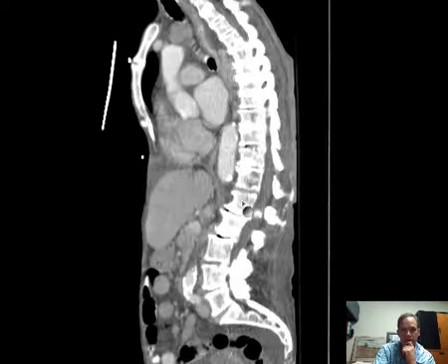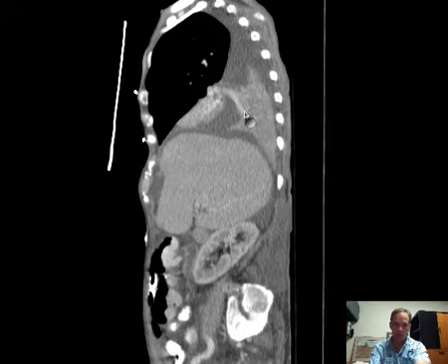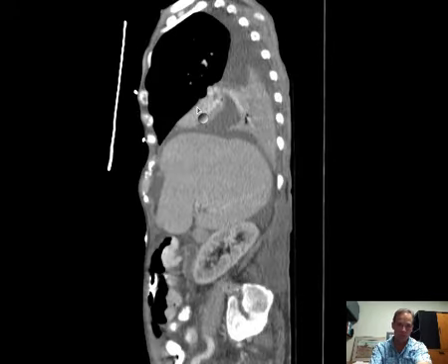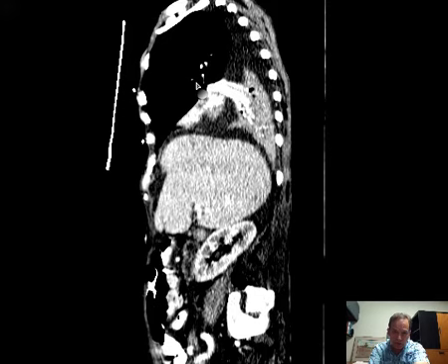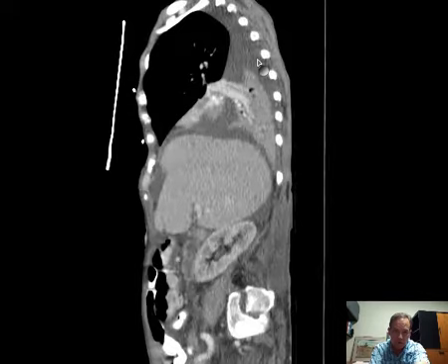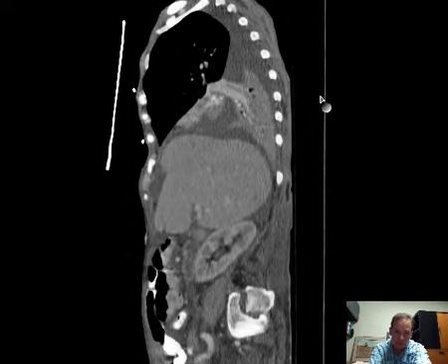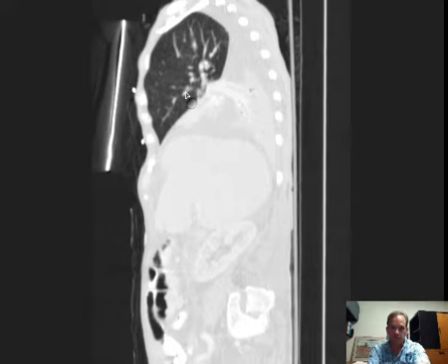So I'll go back to the right side, and we have a right lower lobe here, and it has its own artery, the right lower lobe pulmonary artery. We have right middle lobe here that looks pretty much like it's just the middle lobe. I don't really see any division to distinguish that from adjacent lung right around here, let's say.